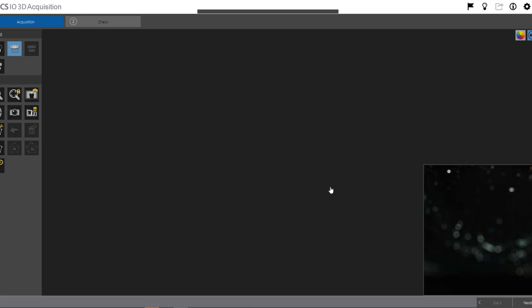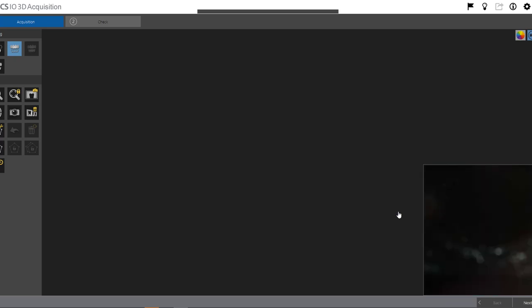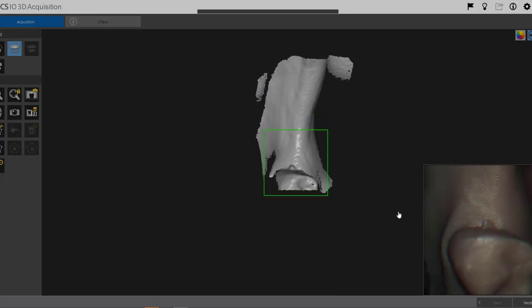Many people do prefer the flexible type partials, but we've not really had great options until now to be able to do that for ourselves. So I'm going to show you a solution to that. So this is just a model that I'm scanning.